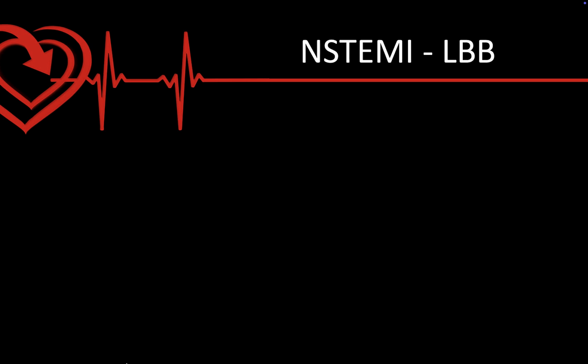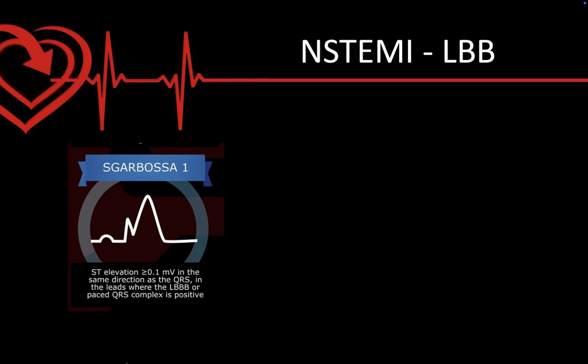One of the most common imposters, one of the things that looks like a STEMI when it's not, is bundle branch blocks, left bundle branch blocks in particular. Now, left bundle branch blocks, as I said in another video, are also a really common occurrence in a new MI. So one of the criteria that we look at is a new onset left bundle branch block is likely to be caused by an acute event. And there's some criteria we can look at in the presence of a left bundle branch block to determine if this is likely an MI. This is termed Sgarbossa criteria. It's been around for a long time, and there's a few of them here.